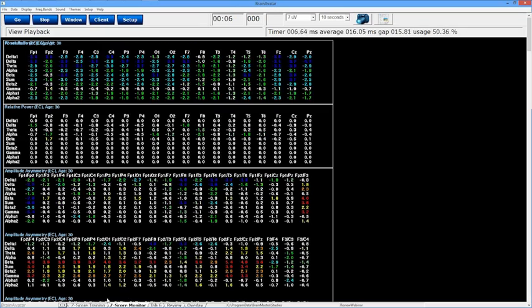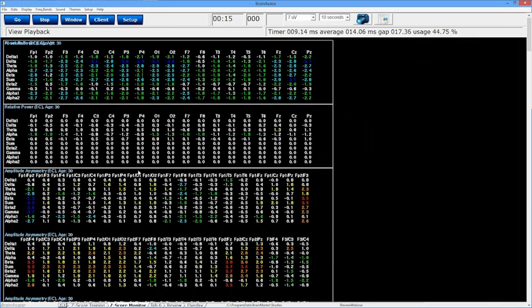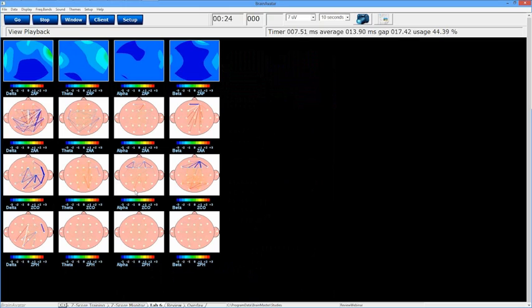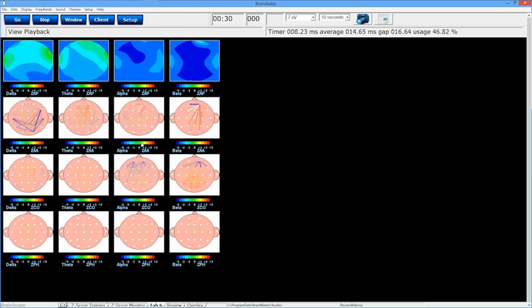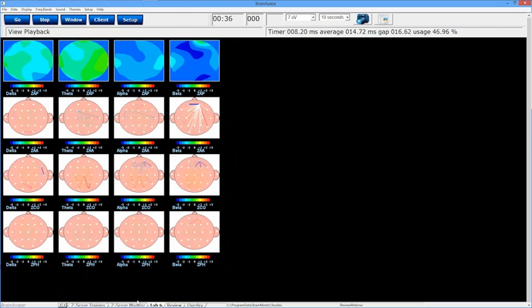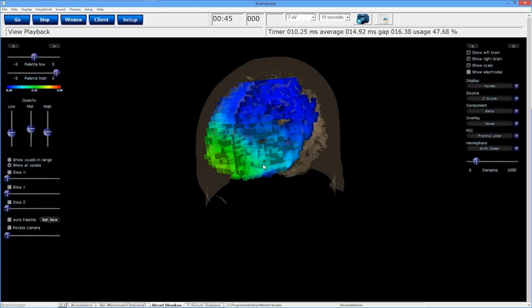We're going to let all the information come in. I am going to turn off my training just real quick by moving that up. We're going to go to my Z-score monitor. I'm going to be able to see my Z-scores rolling in right now and see what's going on. I'm going to be able to go right here and see my maps of exactly what is occurring and changing based on the information that I chose right here as it's jumping and playing. Now I am also going to go to my head display right here, and I'm going to utilize this to see a little bit more in depth.